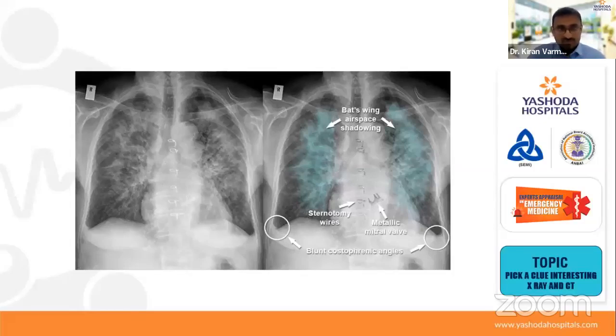Okay. Now, are you able to differentiate between these two, ARDS and pulmonary edema secondary to fluid overload? Simple. Pulmonary edema is central and perihilar. It gives the appearance of batwing. Kerley B lines will be present in case of pulmonary edema secondary to fluid overload state, might be any other reason, CHF as well. In case of ARDS, it is diffuse and not only in the center but also located in the peripheries. It gives infiltrates, cotton woolly spots.